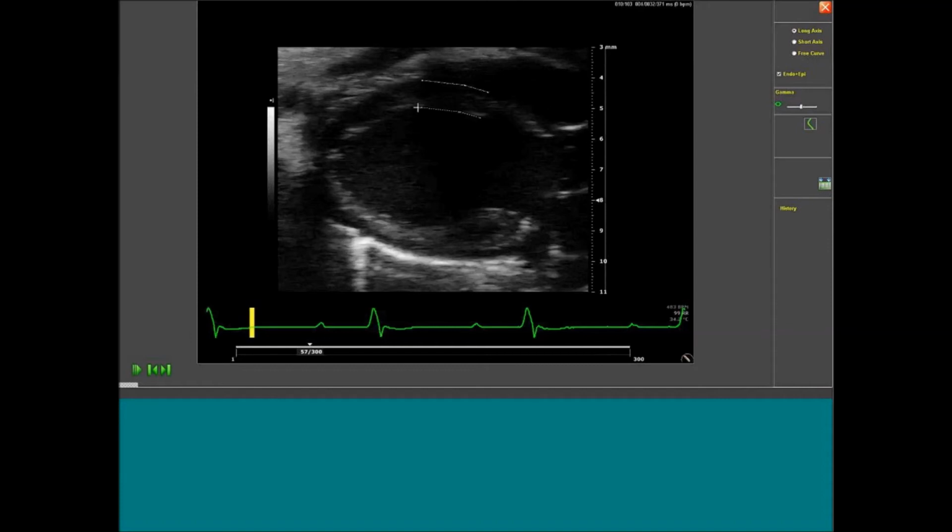So I'm just going to start clicking, placing points. You'll see I'm placing the endocardial points, and the epicardial points are popping up and following me in kind. I should mention here that this is where I typically start and stop my tracings in VevoStrain. If you've been familiar with VisualSonics for a long time, if you've used Strain before, and you look back into some of our older collateral, you might see, with respect to VevoStrain, the traces extended right out to the base on the anterior and the posterior. And that is the way that we used to approach doing the traces.